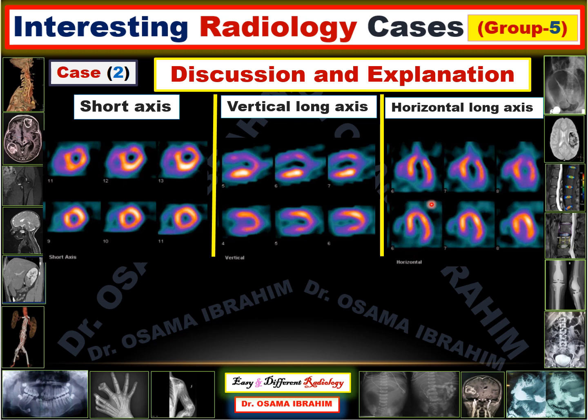However, when arranged like this, the myocardium, this is the horizontal long axis. And the apex at that time is at the superior or upper part of the film. And this is the septal wall, as you see the other ventricle here, and this is the lateral wall. However, here you can see the anterior wall and the inferior wall. The 4 walls, anterior, inferior, septal, and lateral, can be seen in the short axis. So this is the axis which takes in the tracer.